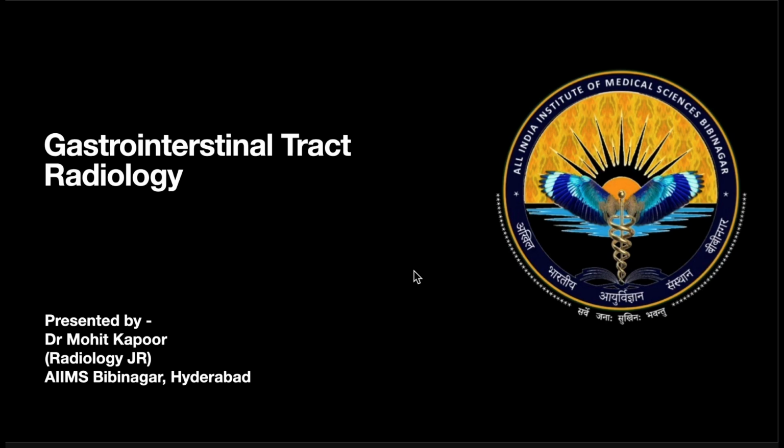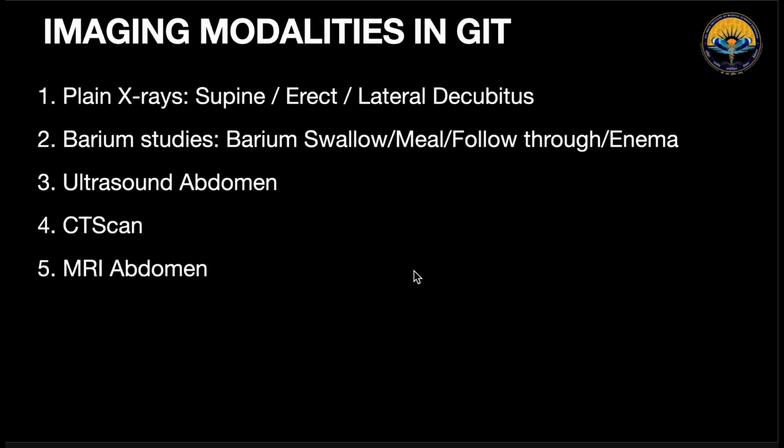I'm a first year radio diagnosis JR at AIIMS Bibinagar, Hyderabad, and today I'm going to discuss the radiology of the gastrointestinal tract. The imaging modalities which we are going to see here are plain X-rays, barium studies, ultrasound, CT and MRI. In this lecture, we are going to discuss the plain X-rays, barium studies and ultrasounds.